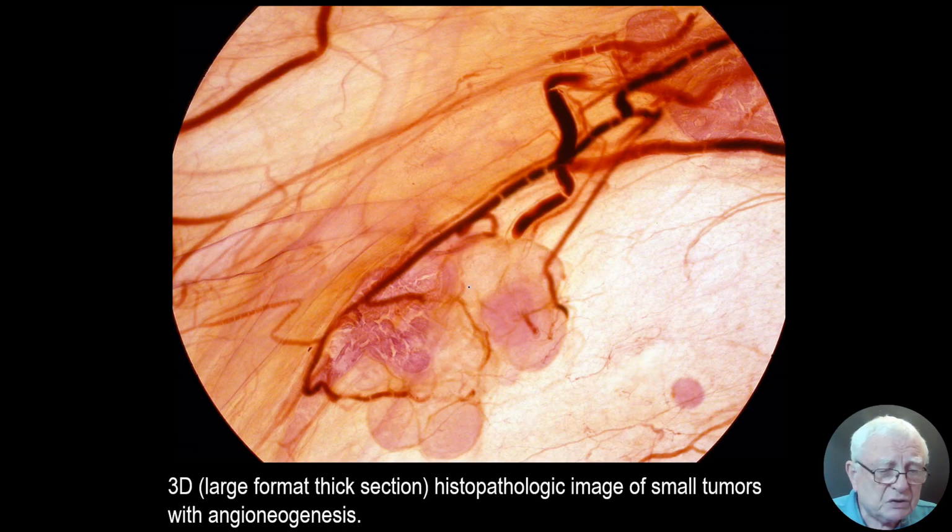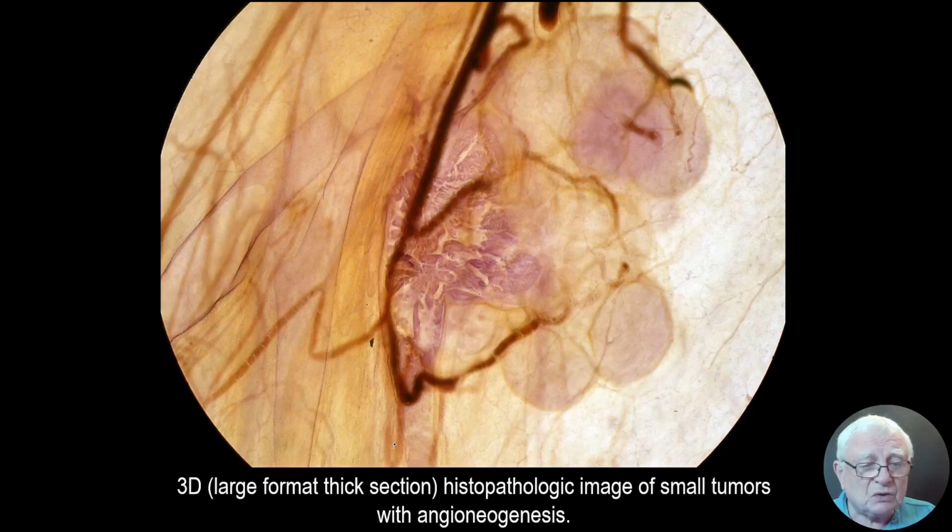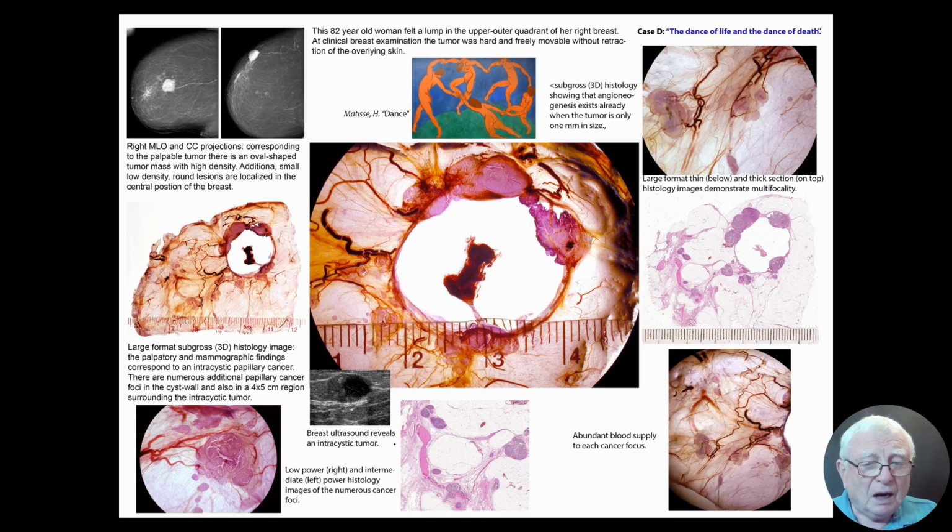The cancer cells send out a chemical signal: give me food. I want to grow. I want to cause harm. And this one, and this one, all of these are papillary cancers in that single picture. I can send you this picture too. This is exactly the same case.